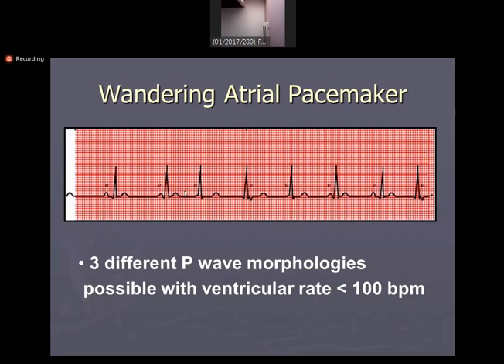So the QRS complex is joined to the T wave through the ST segment. So a complex joined by another complex or wave is called a segment, and an interval means the beginning of one complex or wave to the beginning of the next complex. It is called an interval.